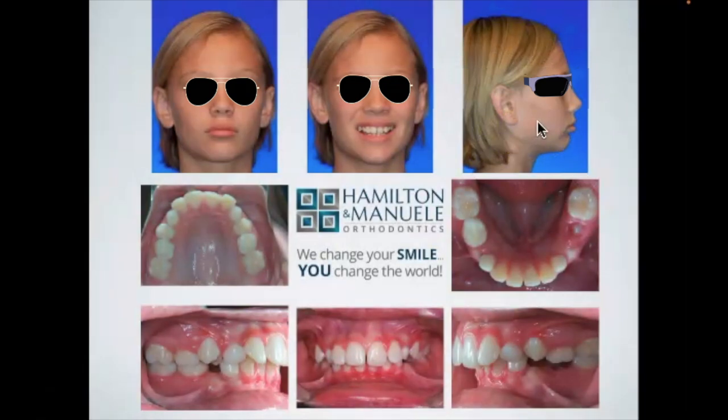So, with the upper jaw being relatively normal AP and the lower jaw being recessed, what about the proclination or retroclination of the teeth? Is that affecting our overjet in a negative or positive way? Again, I'm not showing you a Ceph, but just look at these images. The upper incisors, for instance, are those proclined, retroclined, pretty good? Yeah, they look pretty good.